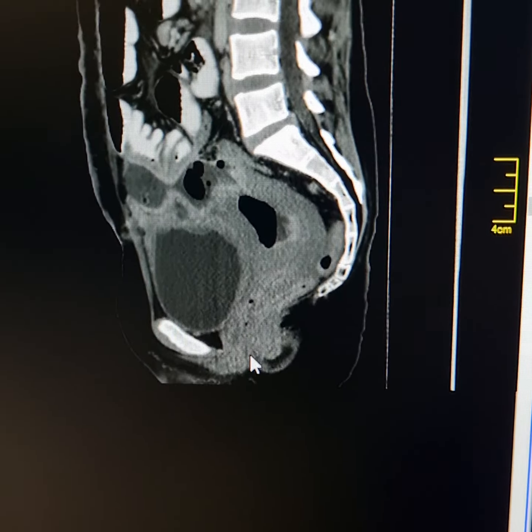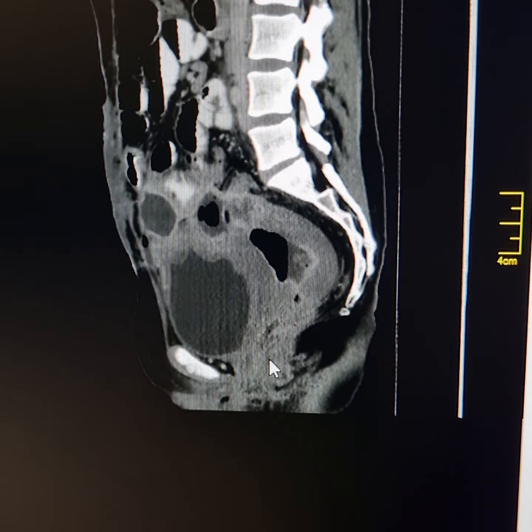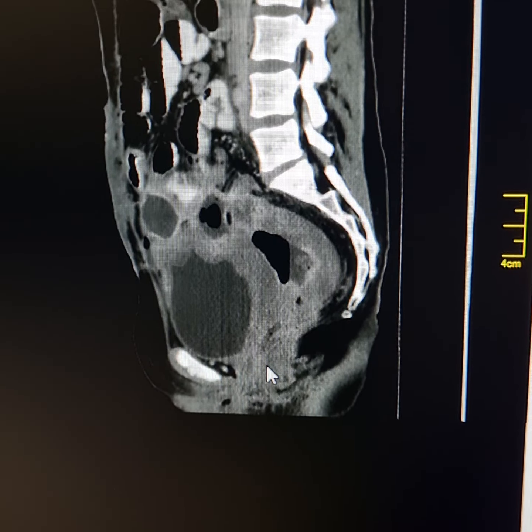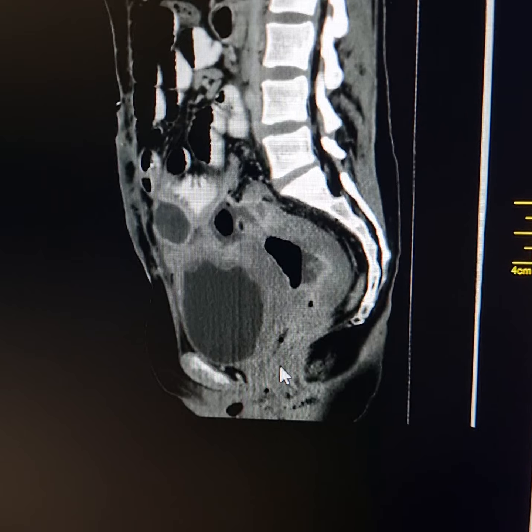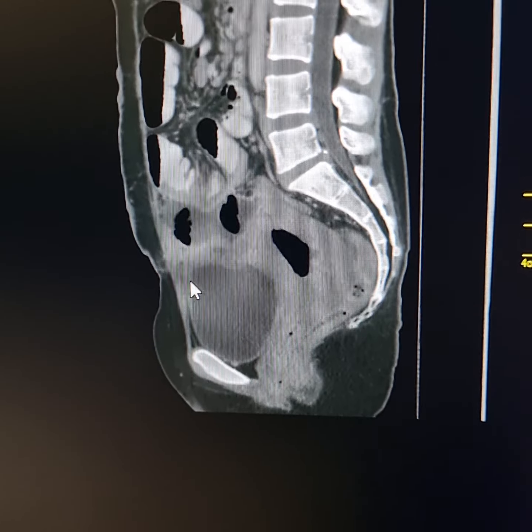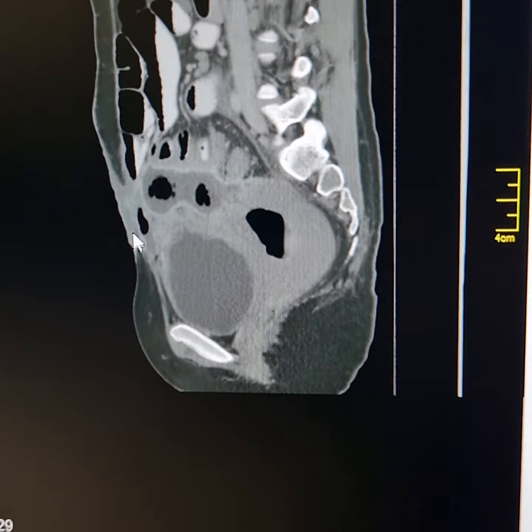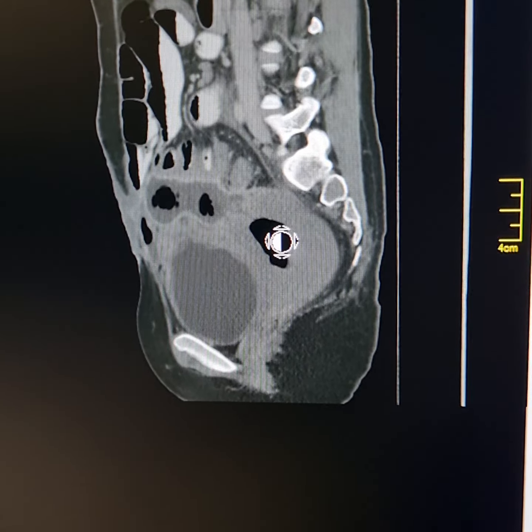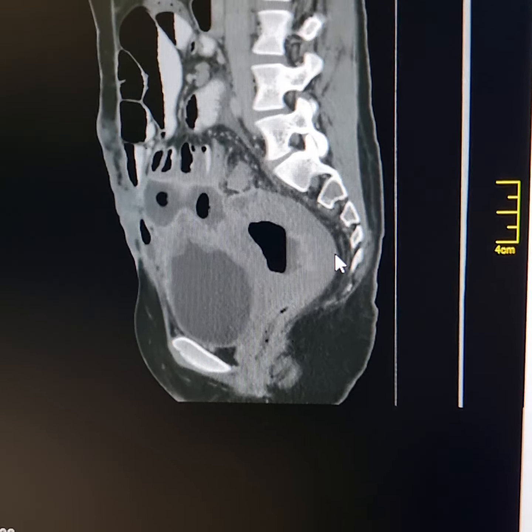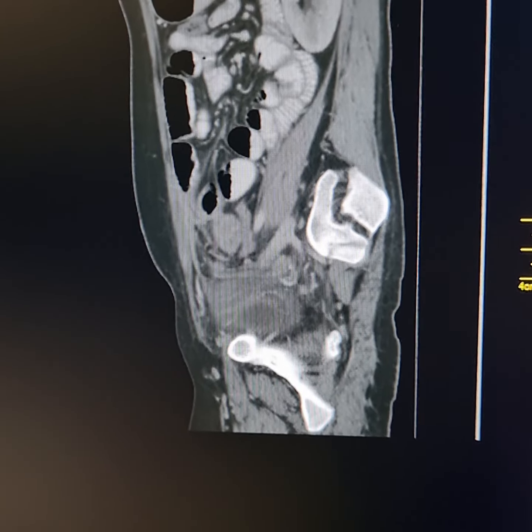And so pus discharge with which the patient has presented, in fact, is coming from this abscess down into the uterine cavity and then downwards through the rudimentary, rather deformed, reconstructed vagina. Another abscess is also present in the lower part of anterior abdominal wall, this one here. Air lucencies are also present inside it. This one is the abscess here. Patient has mild ascites.